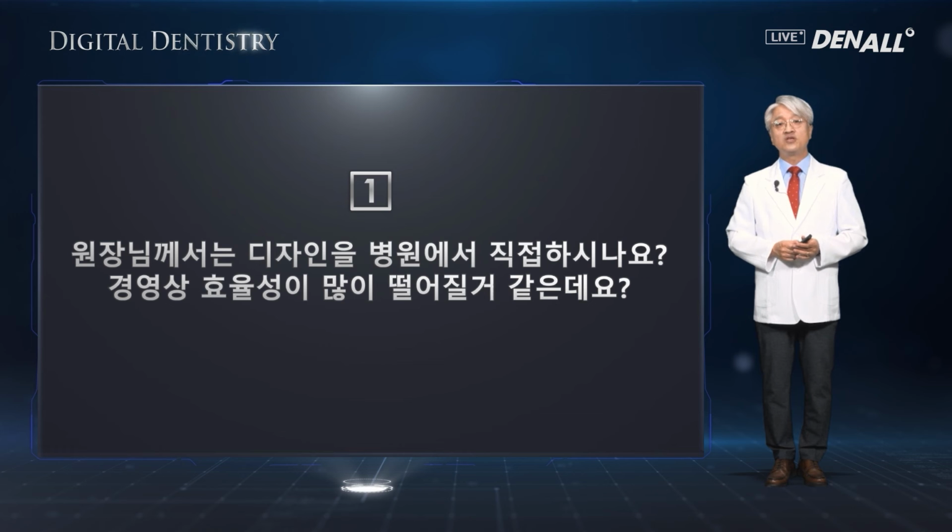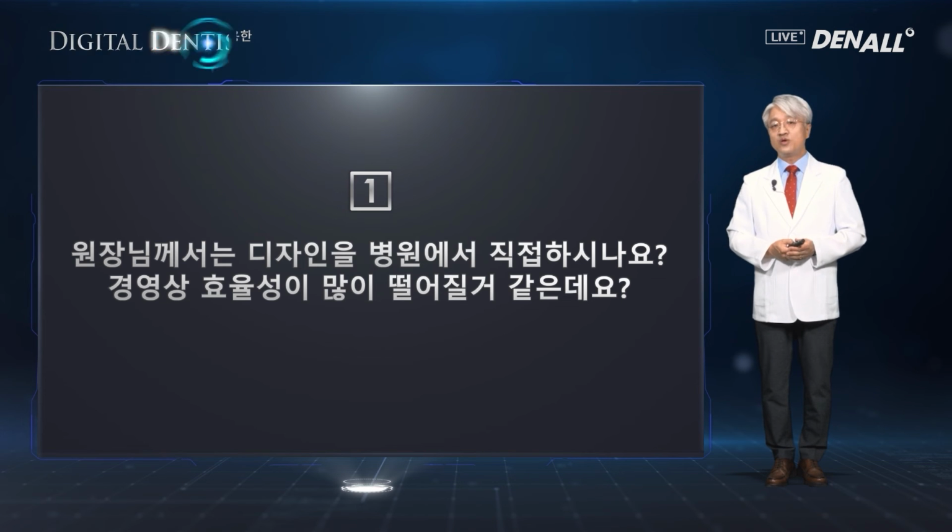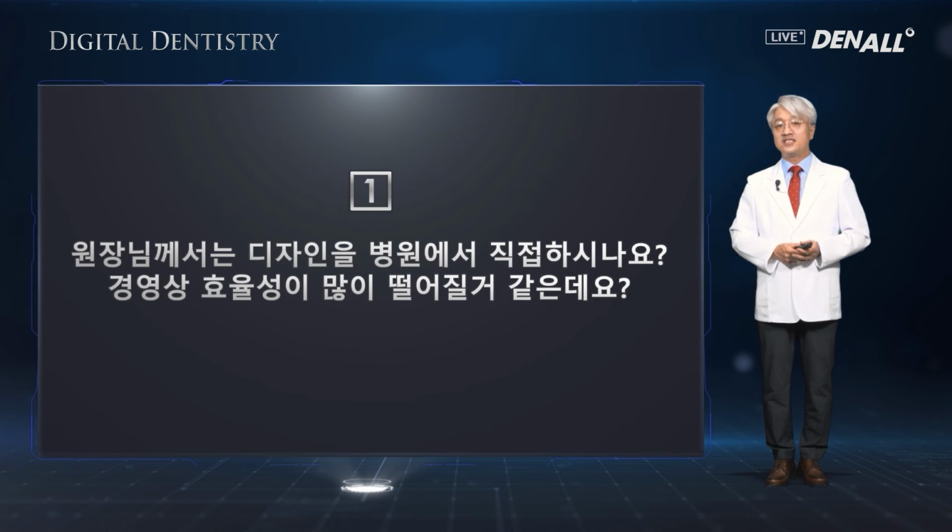So if the lab technician handles all of them, it would be good, but it is not always the case. And we are the ultimate people to take the responsibility for the prosthesis. Therefore, we need to make important decisions ourselves, knowing the situation. In terms of the management efficiency, current software is advanced so much in terms of time and the cost. It is very good to use.